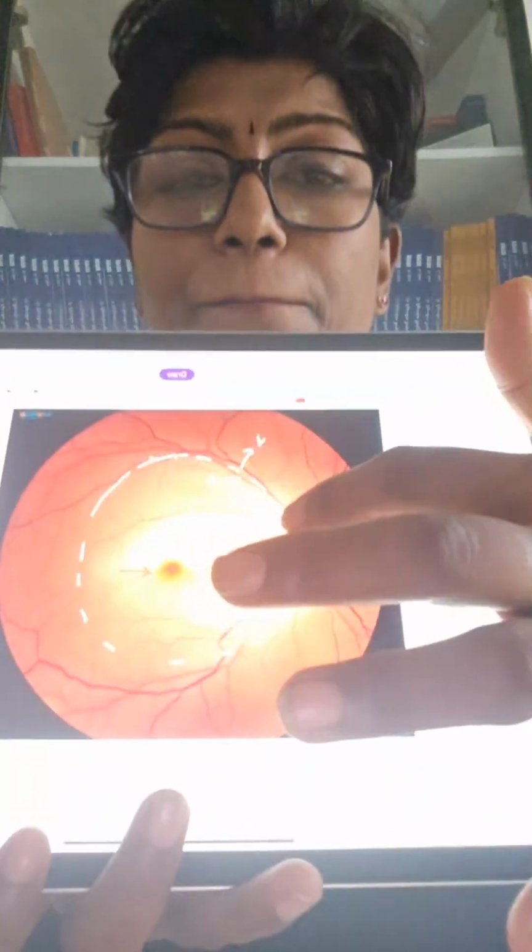When you get retinal edema, for whatever reason, the retina becomes opaque because in the ganglion cells there is intracellular edema. The ganglion cells go into the apoptotic pathway, and you all know basic apoptosis: there is release of intracellular calcium and intracellular edema. So the ganglion cell is edematous. This edema blocks my underlying choroid. I can't see the choroidal orangish red color. That is exactly the reason why this area is all pale.